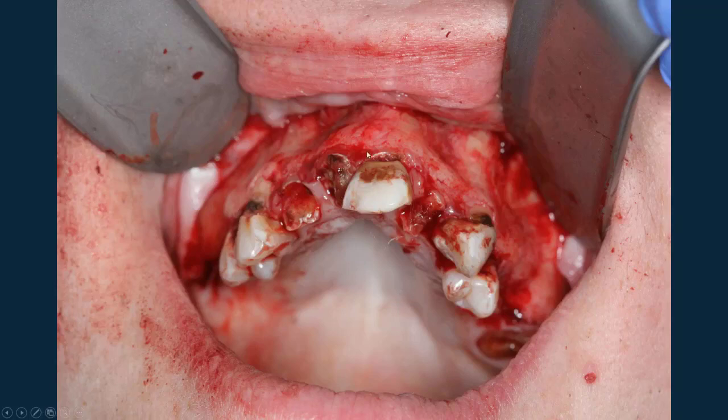Now, I'll tell you that it was an early case where we were kind of prototyping our design and trying it out. So this was just in resin. We didn't bother with the metal printing. Now, when we do these, they're much thinner in profile. They're all metal, which I think makes for a much more stable and smaller guide that requires less reflection. But same principle either way.